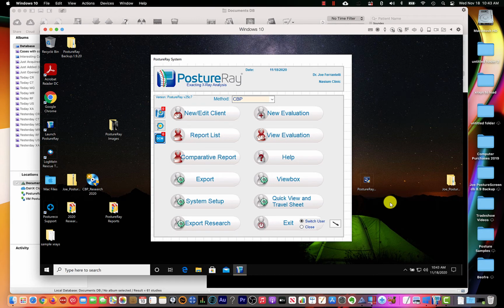Hello, in this tutorial we're going to walk you through a DICOM send and receive from X-ray software. Now, this will be from start to finish. Just please note that we don't support your X-ray software. There's hundreds of different kinds, so you're going to probably have to work with your X-ray vendor.